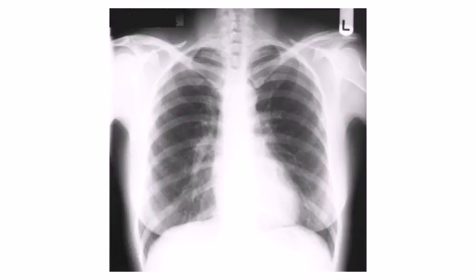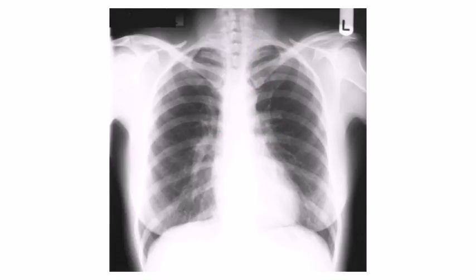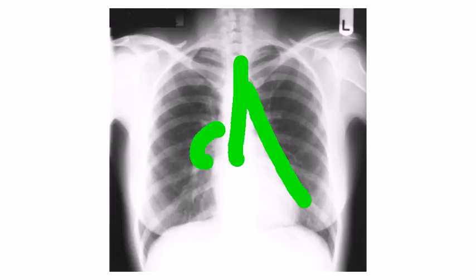The next step is to look at the mediastinum. When you look at the mediastinum, you want to make sure that the trachea is midline. You want to make sure that the area where the clavicles come together puts the patient at least facing front, so that everything looks appropriate. You're looking down the mediastinum as well, making sure the heart borders look appropriate, the hilum is located appropriately, and it doesn't look like there's a prominence of the hilar region.